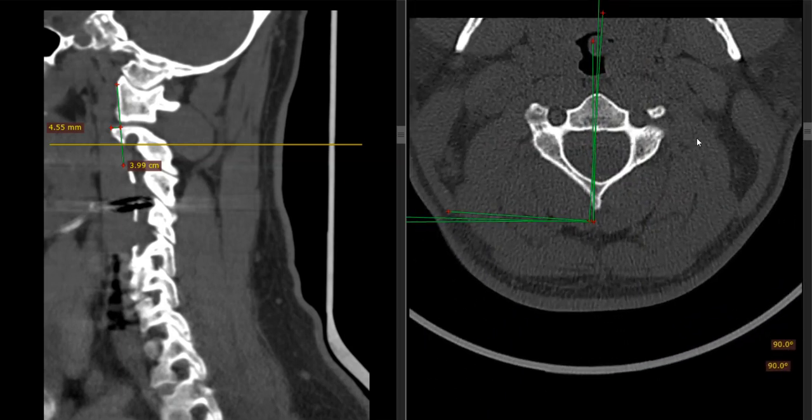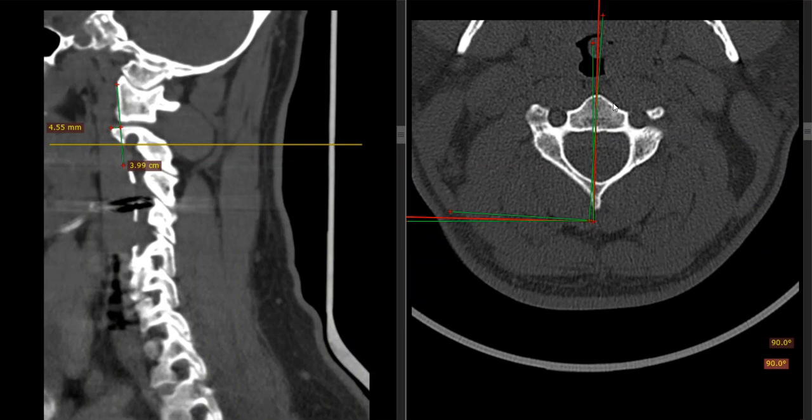So if the skull is here, this is what I call the Indian burn of the head. C1 is going to the right, and C2 is going to the left. And you got the skull trying to sit in the middle of this. And now this is, of course, hold on, let me make sure which one I got here. This is C1. Let me get that right back down there. I'm putting them together based on this.